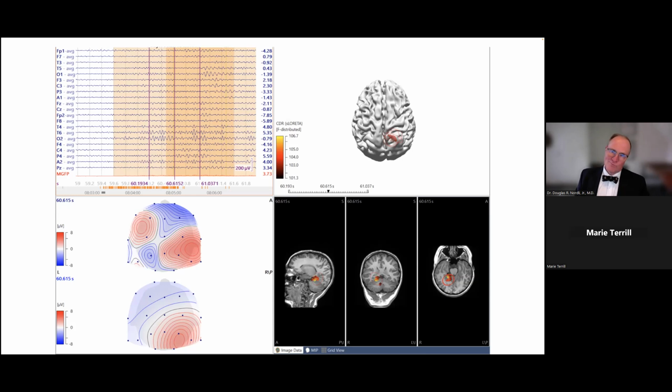So in retrospect, what do you believe? Is this quote unquote ictal analysis, the early features, the accurate thing? Was it the interictal source localization, or were they congruent because it was pointing in this direction and telling you how the spike is traveling, if you will, but not necessarily the depth? And anyway, we got that from just quickly spike averaging. So I think it can help orient you to the lobe and even sublobar location, but be cautious about interpreting the depth of a dipole calculation.